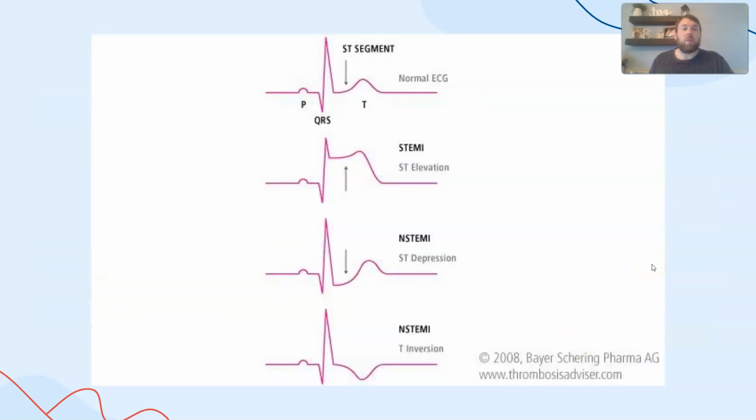I wanted to take a moment and show you exactly what a heart attack might look like on an EKG, because it is interesting to say the least that a doctor could look at an EKG hours and maybe even days after a cardiac event and be able to see what exactly goes on from days before. So what we have here is the normal EKG.